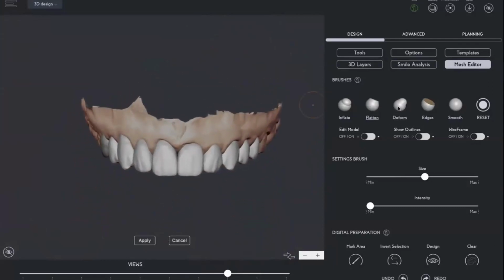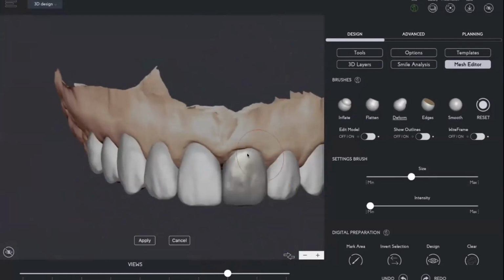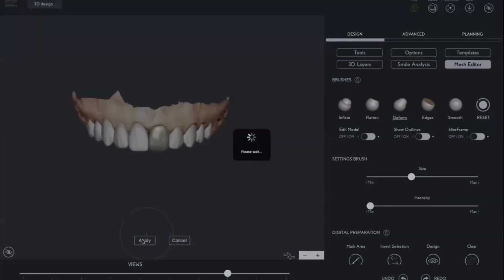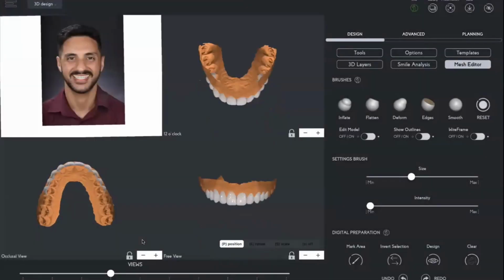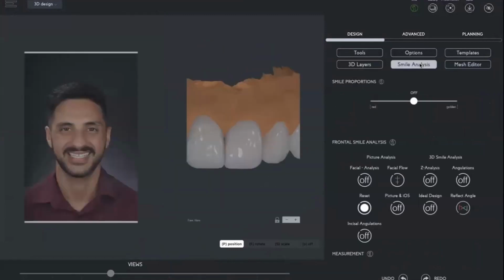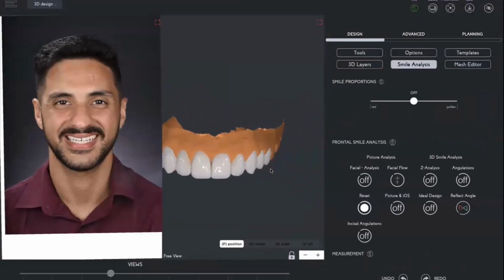Here we go. There is something that I don't like here in this case, but for that we go on now, because we have the 3D smile design done, as you can see, and it was 2 clicks and 1 minute adjustment. Now we have the time to discuss with the patient something that is very, very cool, and I integrated in SmileFy decades of knowledge and scientific papers regarding smile harmony.